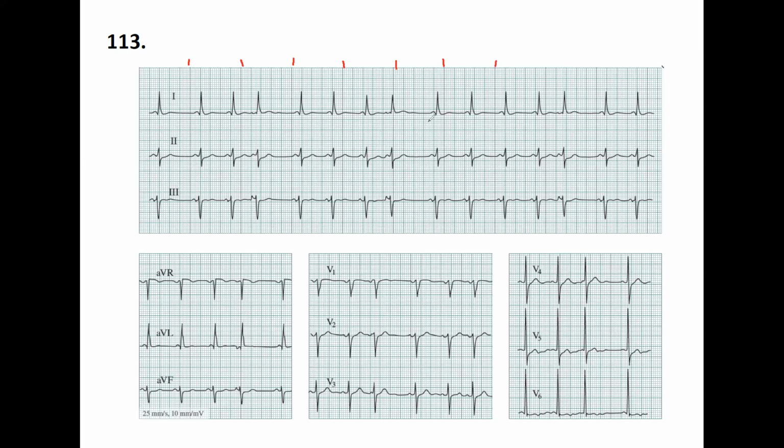I checked lead 1 and it was positive, so I set the starting lead at 0 degrees on the right. And I checked aVF and it was negative, so I knew it was somewhere between 0 and negative 90 degrees.